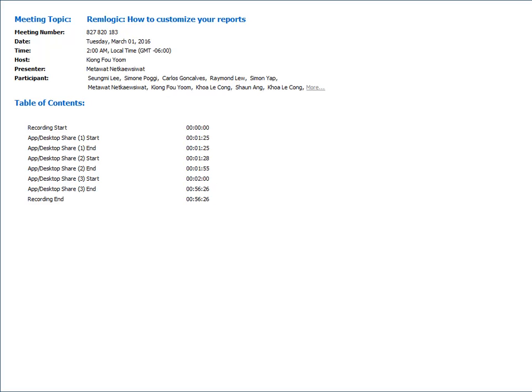So we shall begin with our webinar session on RemLogic, how to customize your reports. I will then share my screen now, and I'll first go through the presentation slides, and then I will show you hands-on how we go about customizing the reports.